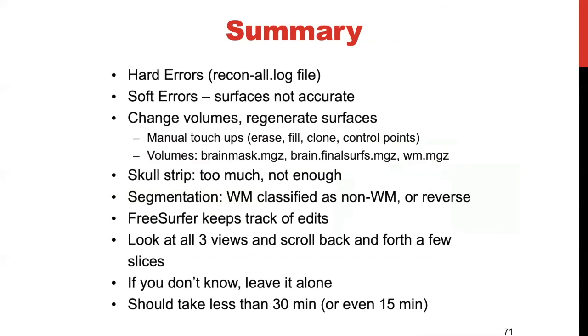When analyzing your data, look at multiple views, not just your coronal or sagittal view. If you don't know whether or not to make an edit, just leave it alone, or send us an email and we'll help you make those changes. Last but not least, your edits should remain less than 30 minutes, perhaps even 15 when you become an expert.